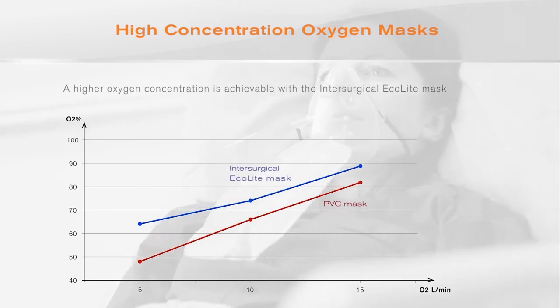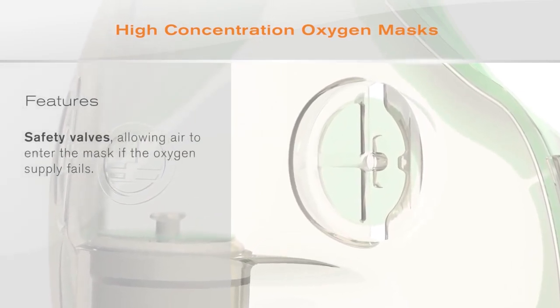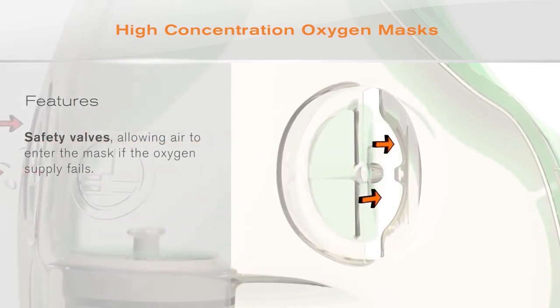This improved performance, however, makes it necessary to include mask safety valves. In the event of the oxygen supply failing and the reservoir bag emptying, the safety valves will open, allowing air to enter the mask and the patient is still able to breathe.